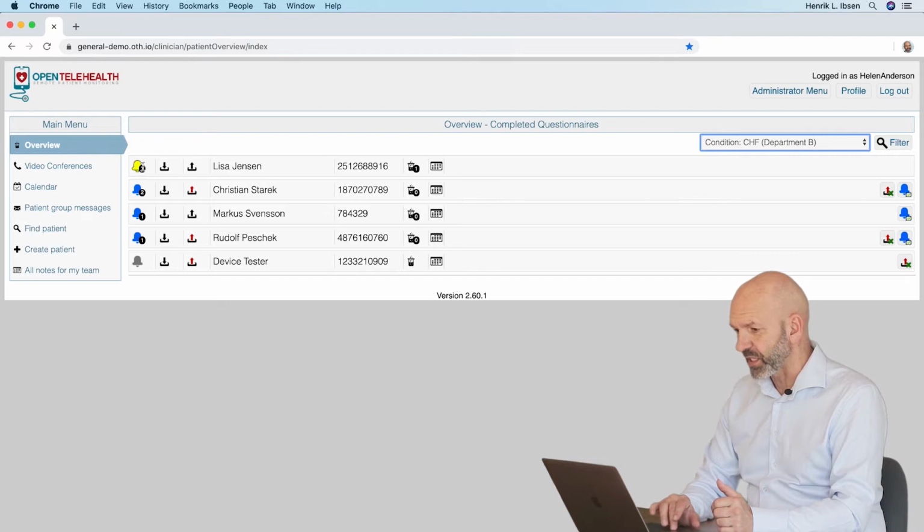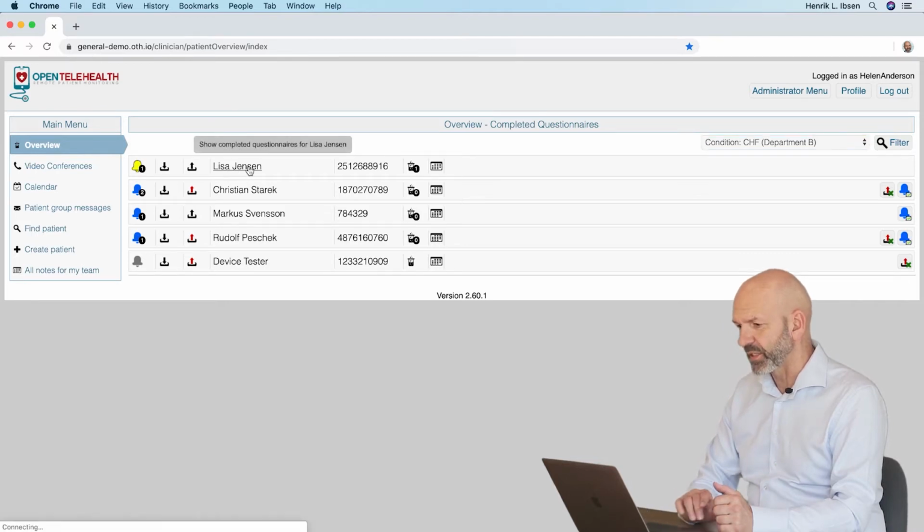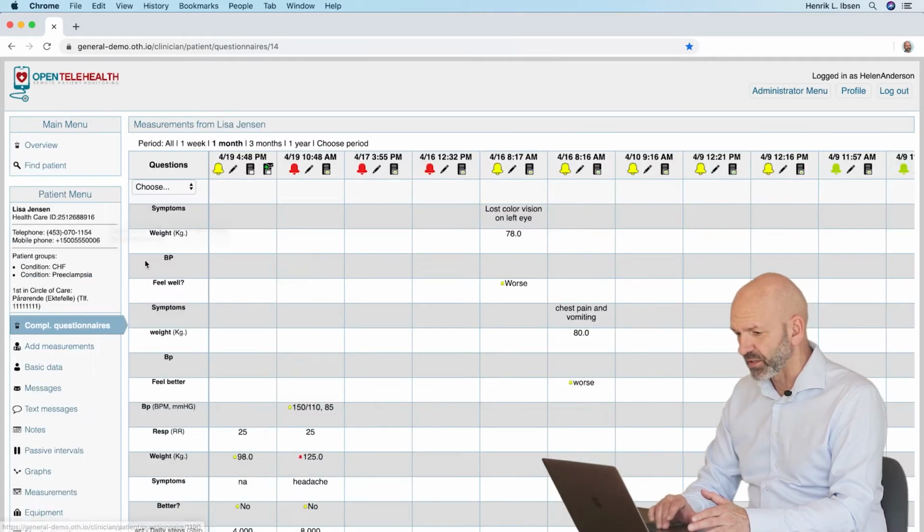Since I'm a nurse with specialty in heart failure, I have my patients, and the other ones with diabetes or COPD or pregnancies or midwives, they have their patients in their patient groups and operate with them and receive their data. And today I have on my list Lisa. Before I look at the data that has been submitted from Lisa from home, I will have a look at what kind of patient she is.